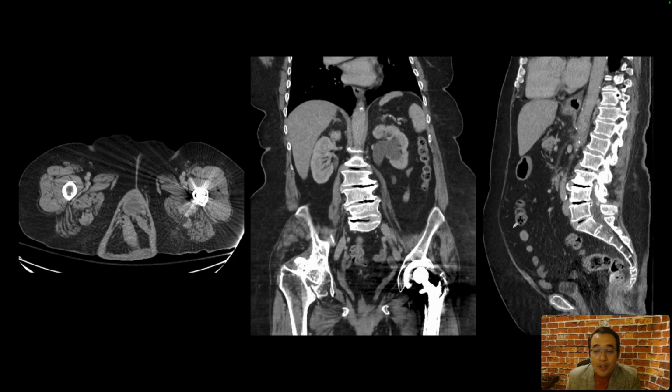Here's our next patient, and this patient has pelvic floor descent. We can see a large part of the pelvis is outside their body, descending inferiorly, seen right here on the sagittal image as well. And a part of the urinary bladder and ureters have also herniated down below in the prolapse, leading to left-sided hydronephrosis.